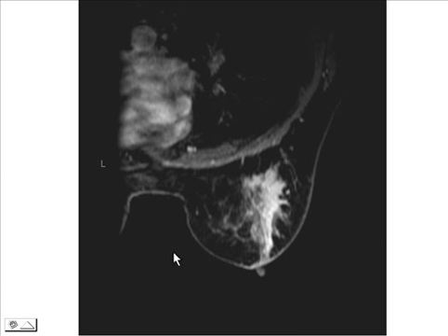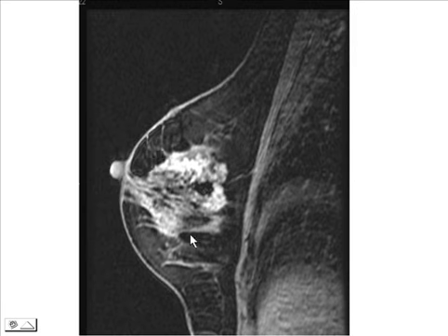Now that we're using MRI more frequently for screening for high-risk women, we're finding just routine screening MRIs picking up findings that we have to look into. So in this case, this routine MRI picked up an area of segmental linear enhancement. That's right here. And using MRI jargon, segmental linear enhancement is what you see when you have, which can be associated, in other words, with DCIS, ductal carcinoma in situ.